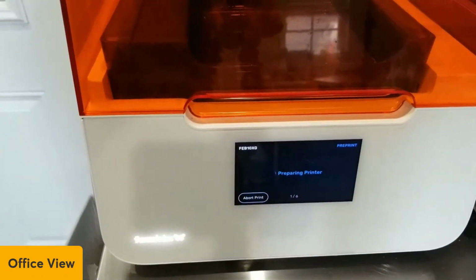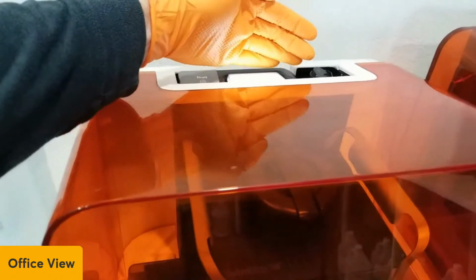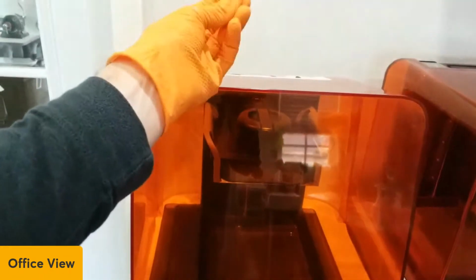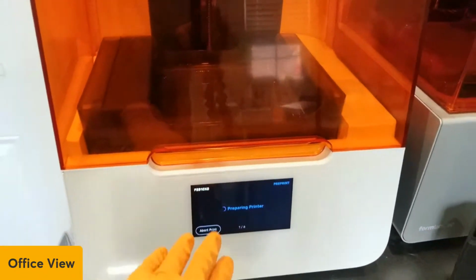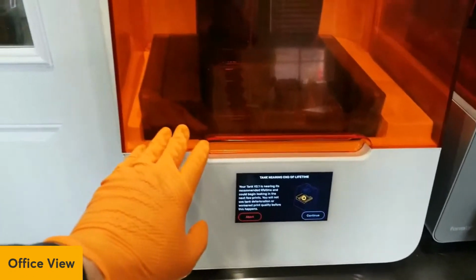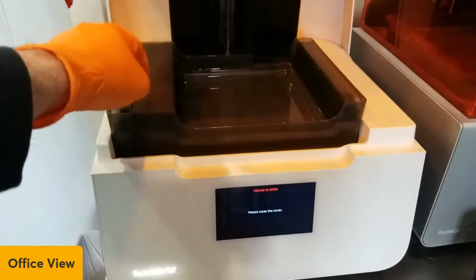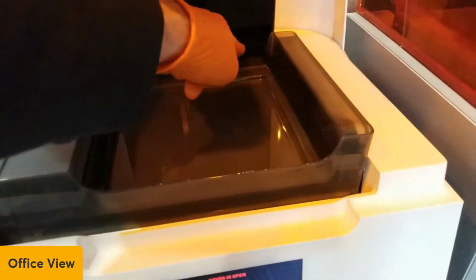And I like this because it lights up here, and then this lights up here, as you can see. So you can actually tell if there's an error or something, that will flash and get your attention that there's an error. And this probably will warn me in a little bit and say, hey, there we go. The tank is nearing the end of the lifetime. So that's what I was saying. I got to order a new tank today. They're about $120 for this resin tank right here. And it's got a float in there that senses the resin height, and that still dispenses resin back there.